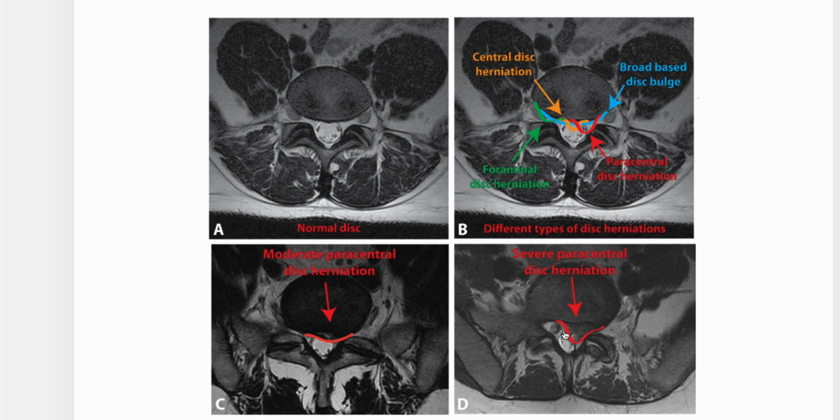A little bit more severe. You see that? It's going to be a lot more intense. Spinal stenosis. This is what I care about for this video. I'm suspecting stenosis based on his subjective, what he's saying when it hurts. We follow the functional movement because that tells us what the diagnosis likely is.